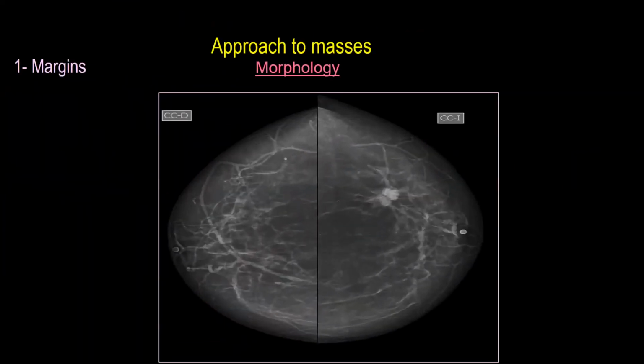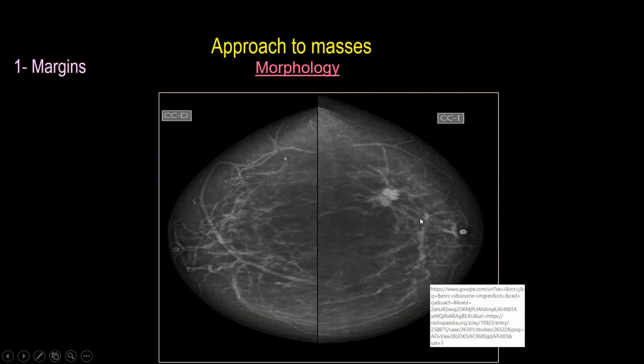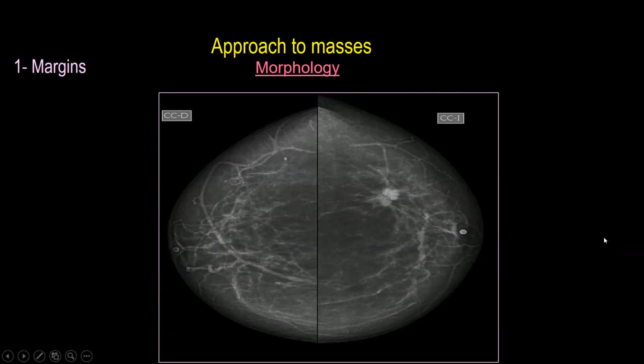Okay? The margin. Sumaya, the margin here? Yes. You said at the start of the lecture that there are more than 3 lobes. I could not recognize what you are saying. Look for the margin of this mass. Tell me. Partially spiculated.